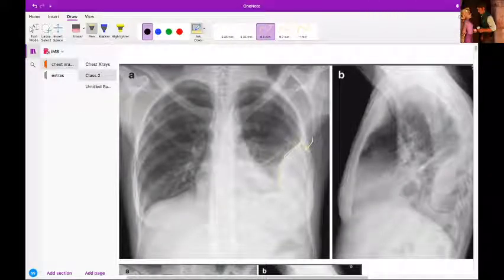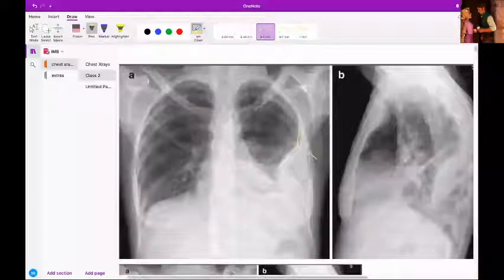It's not pneumothorax. Over here, can you see something? You can see this collection is kind of climbing up on the pleural wall. This is called the meniscus sign, which we learned last time. So this is actually an empyema, a collection of pus in the pleura. If empyema is there, you'll see this meniscus.